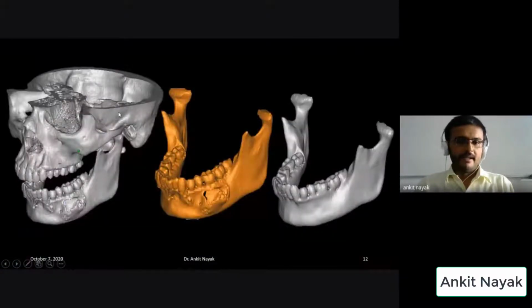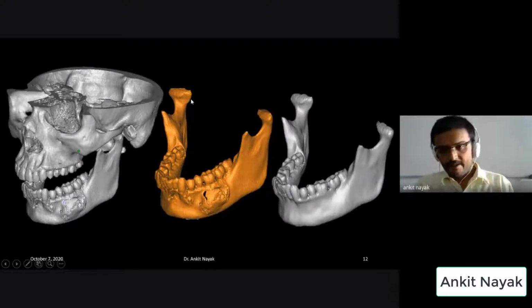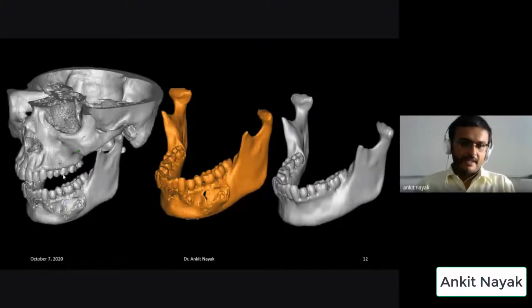And similarly, this is the data of one patient who had a tumor in the mandible, and we want to repair this mandible so that the doctor can plan the surgery, or create the implant for that patient. So in such a case, you have to develop the solid model with the exact dimensions of the patient specification. Such complications are very common when you go for patient specific data preparation, either for 3D printing or for the FEA analysis.